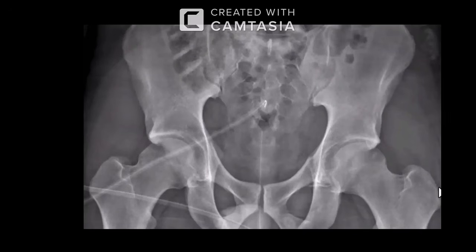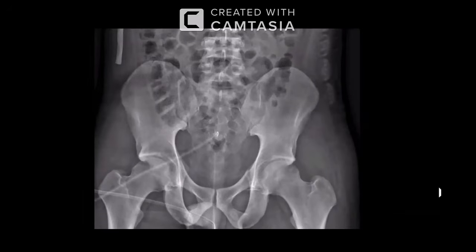I immediately convey the findings because this can be associated with injury to the bladder. So I'll advise for CT to exclude any bladder injury and maybe ascending cystogram. And also, if there is a fracture at the left femoral head, this can lead to AVN. So I'll immediately convey the findings with orthopedic referral and also advise for lateral view of the femur to detect if there are any other fractures, with orthopedic referral to manage the fracture to avoid AVN of the femur. And yes, with the left superior pubic ramus fracture, other than that, I do not see any other fracture lines.